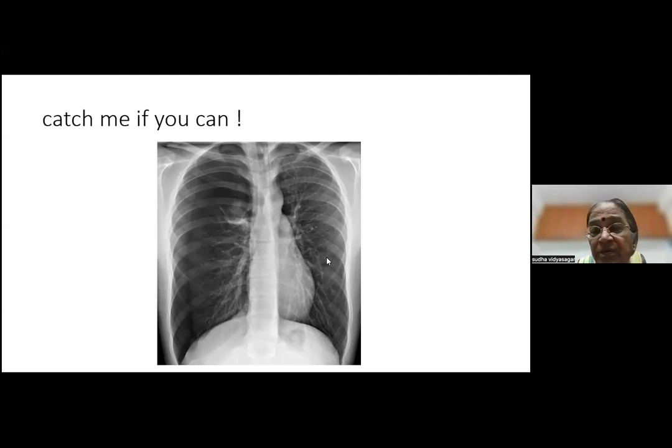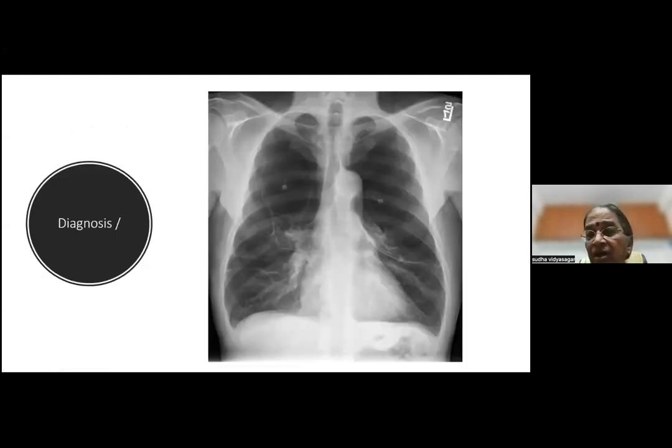So it must be emphysema with a rupture causing a pneumothorax. Before you rule out, always look at the edge of the collapsed lung. There's no pleural effusion anywhere. Right, fine. Let's look at this one. What's the diagnosis in this?